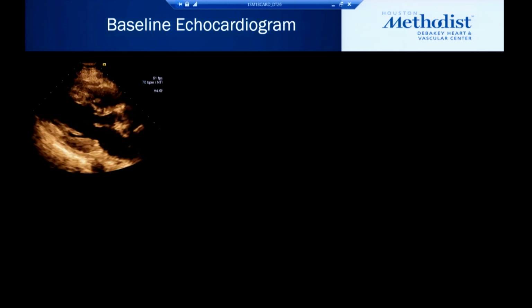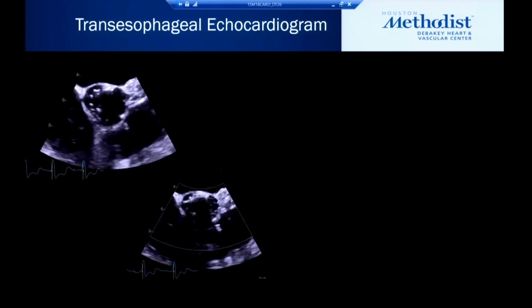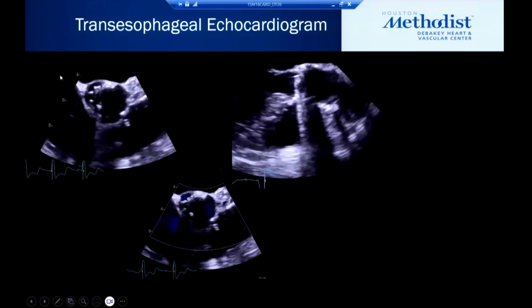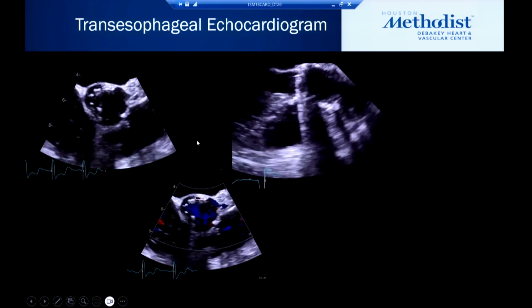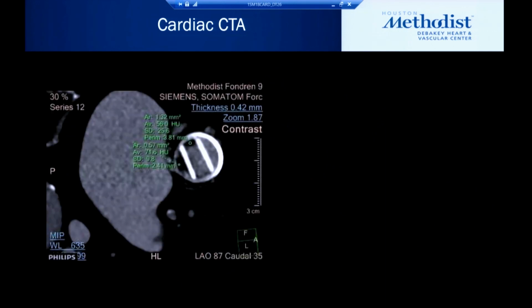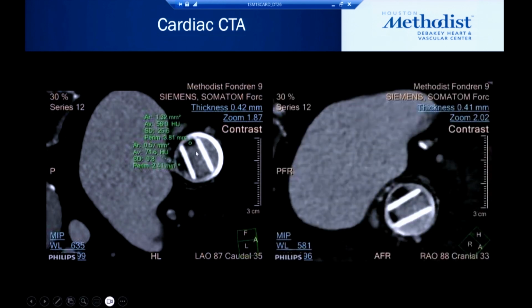So just a quick case. It's a patient with a very high gradient and heart failure, who had a TEE. Again, as Dr. Zoghbi mentioned, most of the time you get this artifact. So there's a little bit of obstruction, a little bit of regurgitation, but what exactly is causing this? After the CT, you see there are two areas of hypoattenuation structure in between the leaflets, and one is underneath the leaflet with a slightly different Hounsfield unit here.